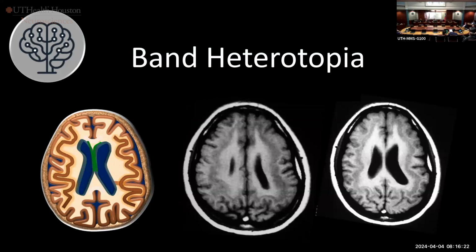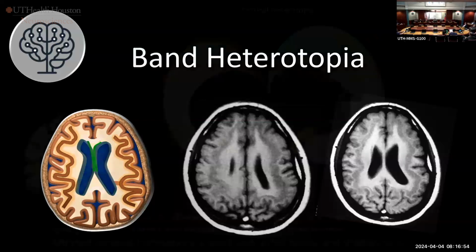So it's very easy to miss if you don't have complete myelination. And T1 myelination, we're going to have a whole lecture of Dr. Patel on this, happens typically by 12 months. So at the end of 12 months, you should have complete T1 myelination. By the end of the second year, 24 months, you should have complete T2 myelination. These are kind of very easy landmarks to remember. So before 12 months, sometimes it's very tough to see this because you don't have a nice contrast between the gray and the white matter.